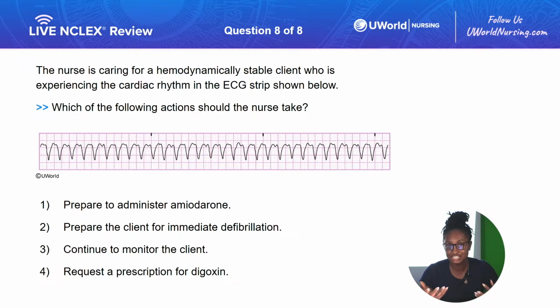I feel like ECG is a tricky type of question, so I wanted to see if maybe we're being a little bit too easy for you guys. You want some more harder questions. Someone earlier said that they would like more heart blocks or junctional rhythms to be incorporated so we can really, really test your knowledge. I feel like a lot of our strips are like the perfect setting in the NCLEX world, which is true. This is what you're going to be tested on.